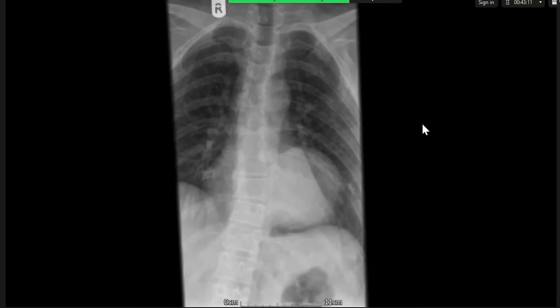I just mentioned that there appears to be quite a large retrocardiac opacity. I don't know if that's relevant in this case. It is relevant. Well, then I should discuss it. There's the appearance of a retrocardiac opacity projected over the lower thoracic spine, which appears to have a level within it, possibly an air fluid level.